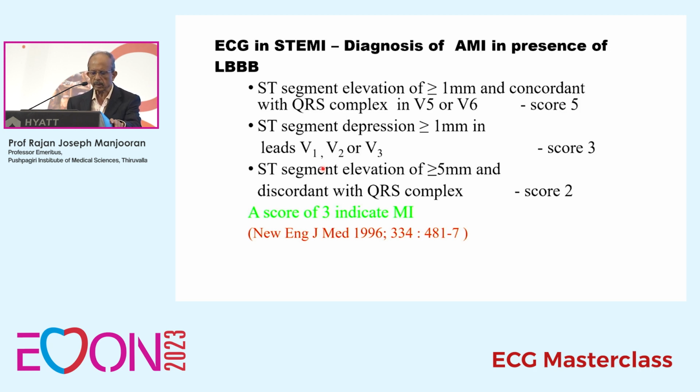And you can see ST segment elevation indicating that the patient had acute myocardial infarction and alternating left and right bundle branch block. And this also is a trifascicular block. And for DM students, if there are any, this is alternating right bundle branch, left bundle branch block with acute anterior myocardial infarction.